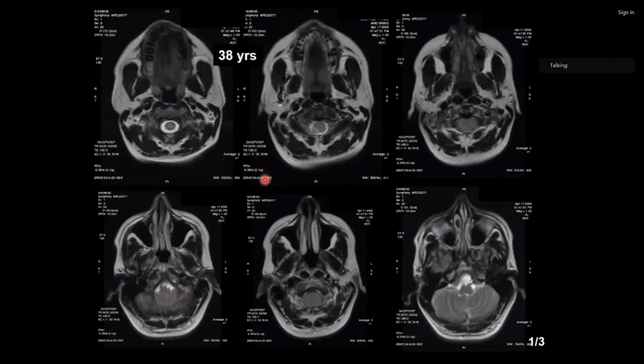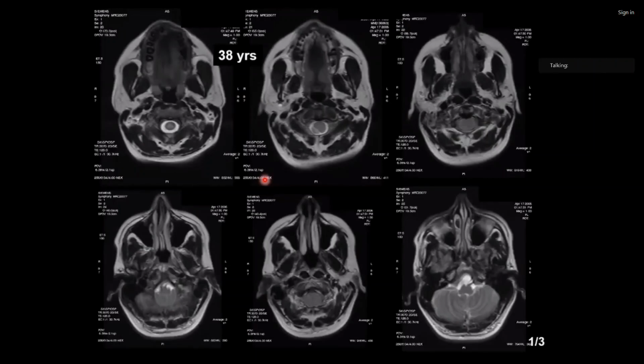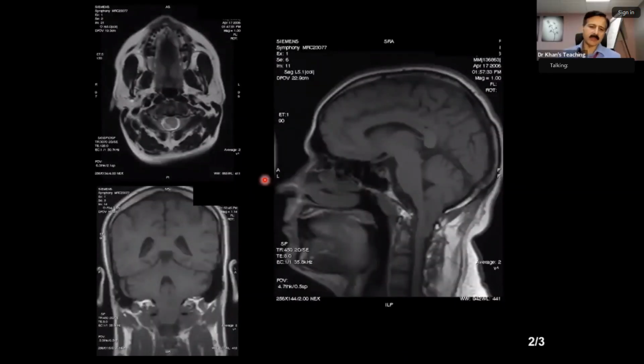I'm just wondering if there's increased intracranial pressure causing some herniation of the tonsils of the cerebellum. Okay, so the patient hasn't got that but something else. You have got the diagnosis. Yes, Chiari malformation. Excellent. So this is Chiari 1 malformation. Please remember, they will show you on an axial slice, and you have to develop your eyes to pick this up.